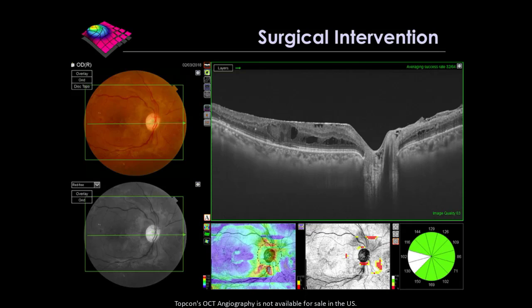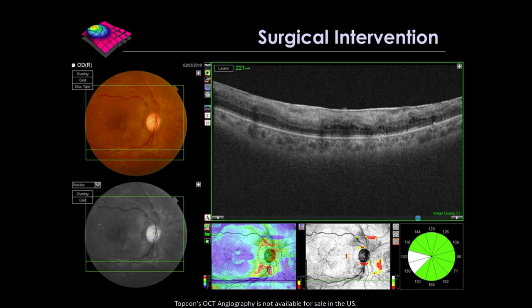Now look at the contrast between the same scan done on the Triton versus the 3D OCT on the same day. It's just a much more beautiful image. And anatomically now she looks amazing. Visual acuity is still pretty much the same after the surgery, but certainly looks a lot better. But at 6/18, 6/12, we decide that she does have this thickening, but we think it is more mechanical in nature. So at this point we decide, okay, let's leave this alone, at least for a short period. Let's just let her settle after the surgery. There's just another cut through there.